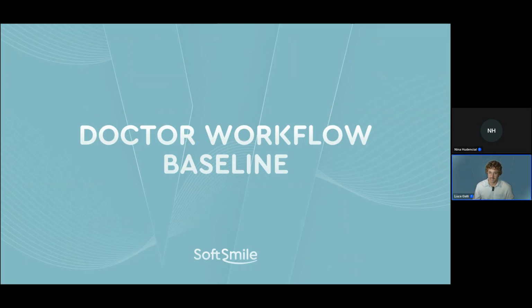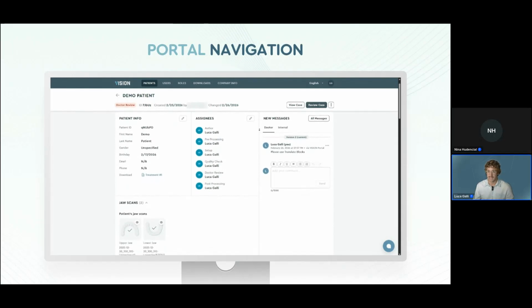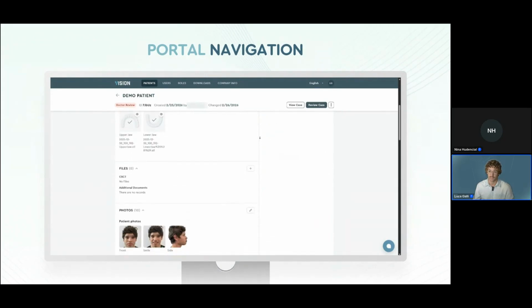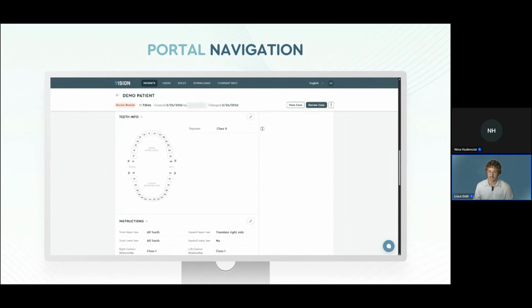So before looking at the biomechanics, I want to briefly show you the baseline workflow within the Vision portal. Here you can see the platform interface. We have access to all patient records, photos, scans, RX, CBCT, and direct communication with the orthodontist who will handle the design on the right. The most powerful aspect here is the clinical control we have during case submission.